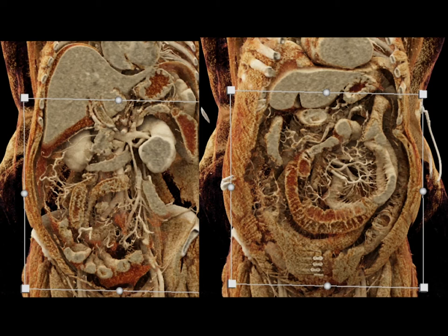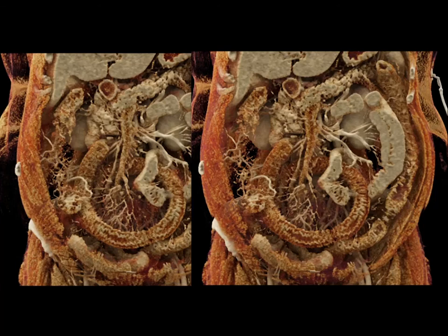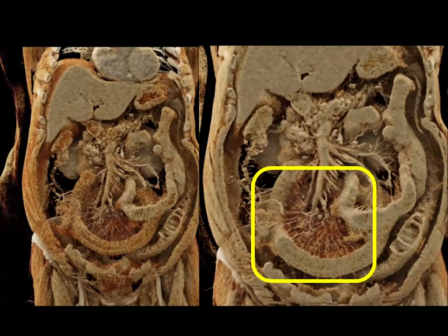The ability to visualize diseased bowel and mesentery, we need to make it more specific, we need more experience, but you can see from these images, it's quite impressive the type of information we're currently able to get, and it is very seductive to shoot a lot of images, which I did here, but look at the diseased small bowel. Look at its appearance, and again, look at the vasa recta.